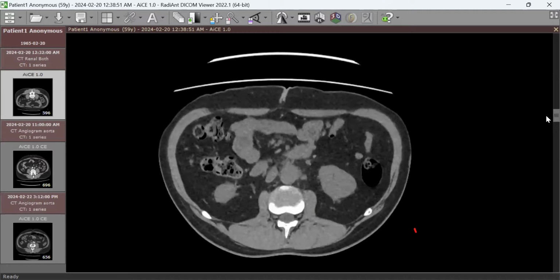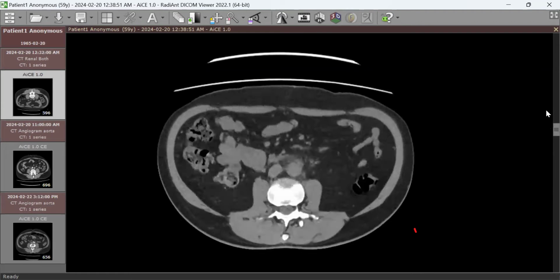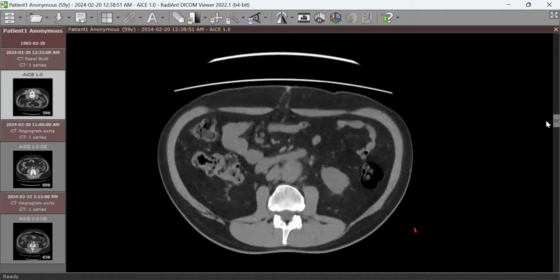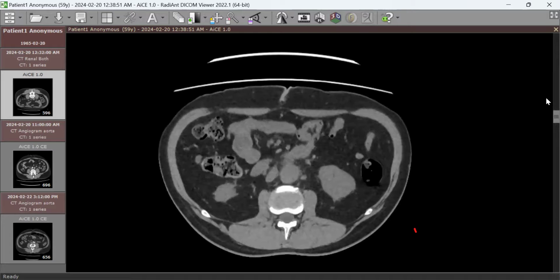So what could that lead you to? What do you conclude from this? There are some aortic lymph nodes. Exactly, there are small prominent lymph nodes, you're right. That's important.